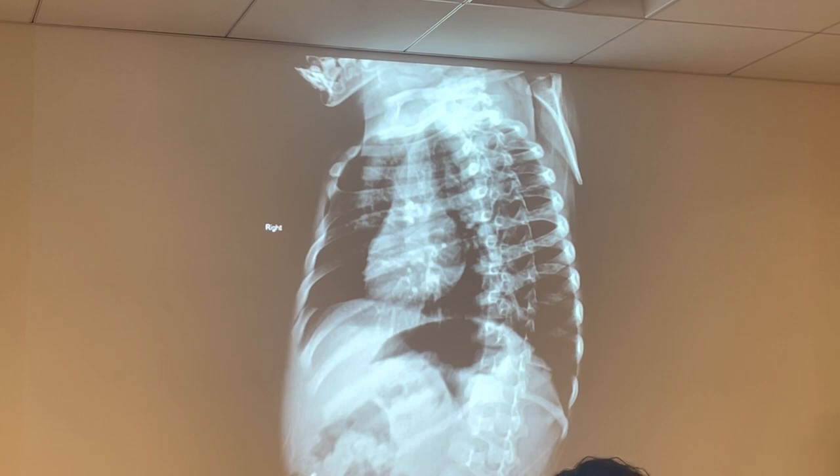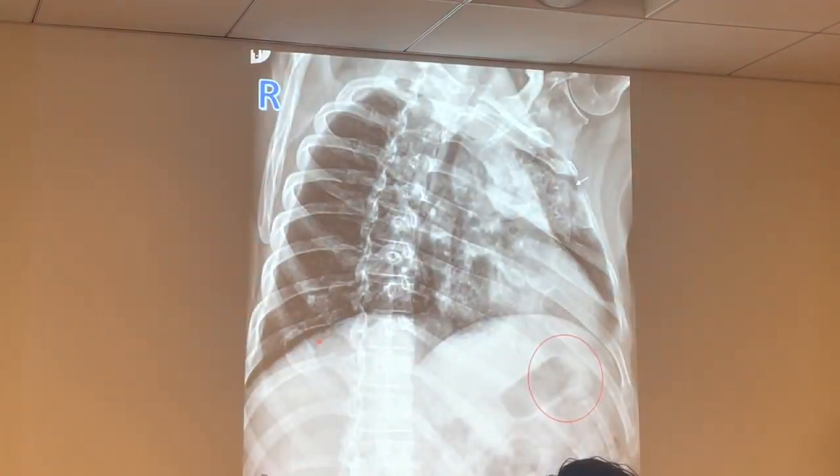What about this right here? Oh, the left is elongated. RAO, so look at the left. Left side's elongated. I mark the side touching the IR. Therefore, what does it have to be? LP. Oh, sorry, RAO. Look at the left. Which arm is lifted up? The left. Okay, wait, do it again.